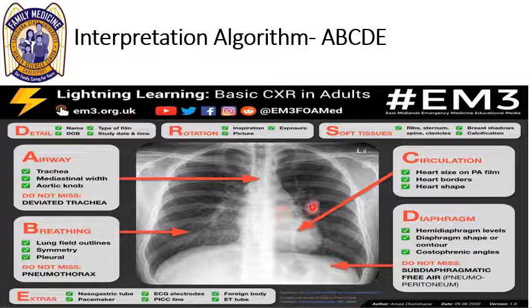If you're working in urgent care or whatnot, if someone comes in and says I have chest pain, you get a chest X-ray, and the reason why you do that is you want to look for other causes of chest pain or the distractors. So looking at the diaphragm here, it's very important that we evaluate the diaphragm levels.